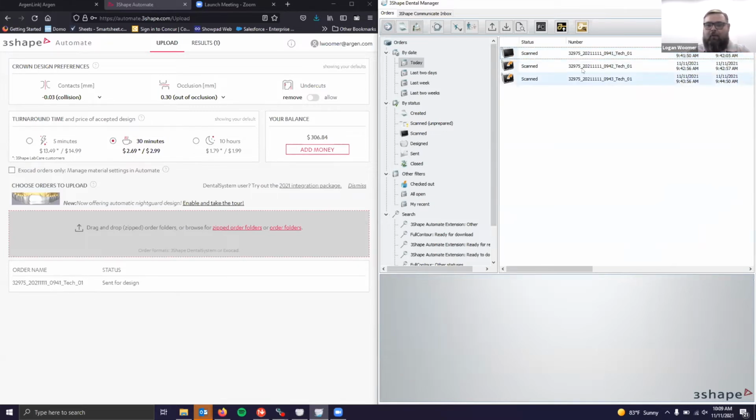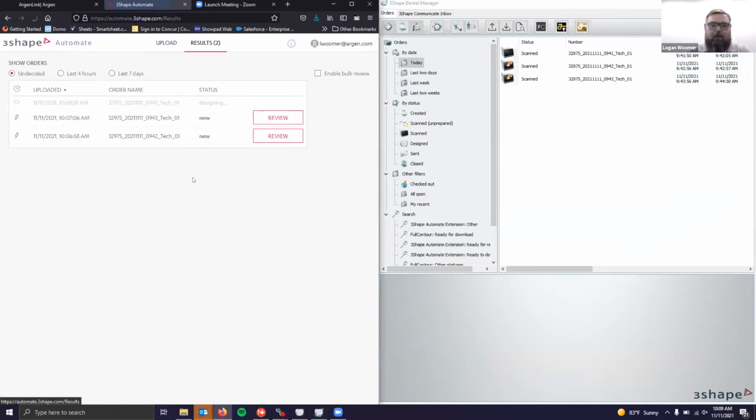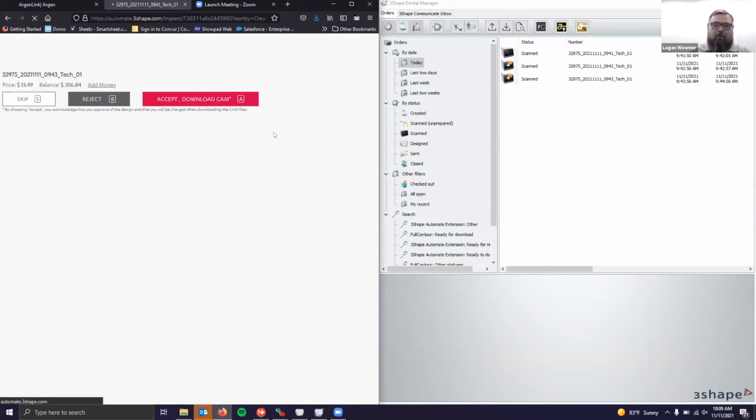And interestingly enough, both of the cases that I sent earlier are already ready for me to review. I requested a 5-minute design. I think the AI that powers this machine got it done in a substantially shorter amount of time, which is very exciting. So I'm going to come over here and click on Review.